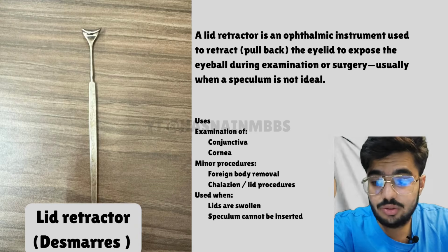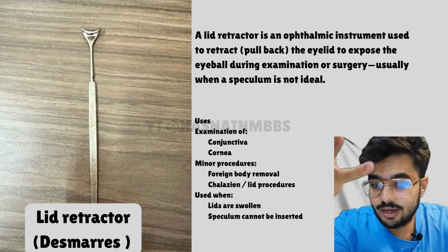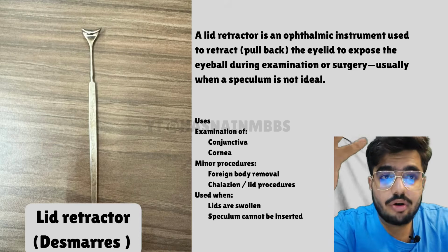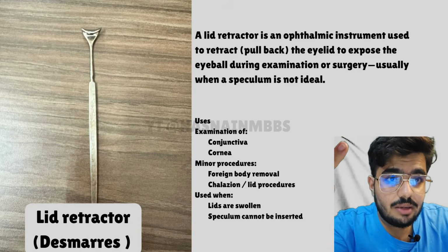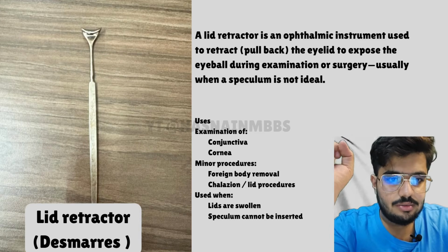Then in that condition, we use this lid retractor. We also use this retractor for minor procedures like foreign body removal or the examination of the conjunctiva or the cornea. That is the lid retractor.